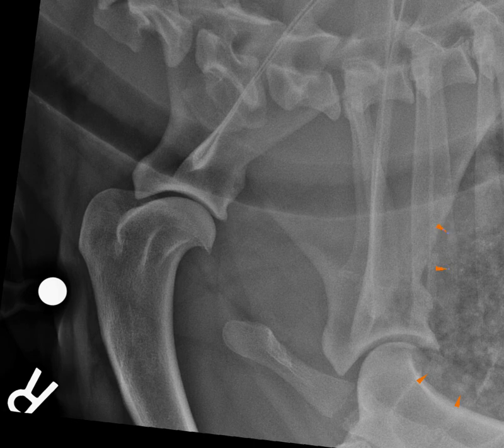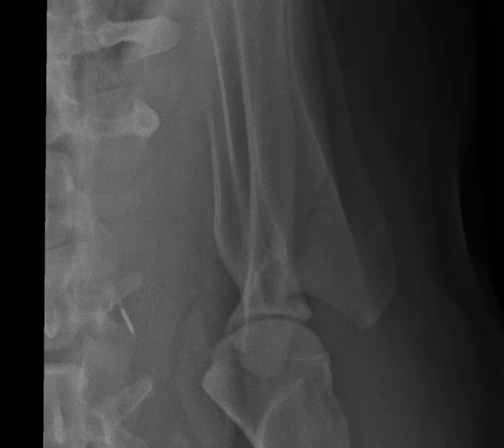I'm going to go to the other view just to remind ourselves what it looks like and to also get the chance to see whether we happen to capture any thorax. You can see on this other view, there's maybe only a whiff of the cranial lung here, and we can't really say much to sort of corroborate what we saw on the other view.